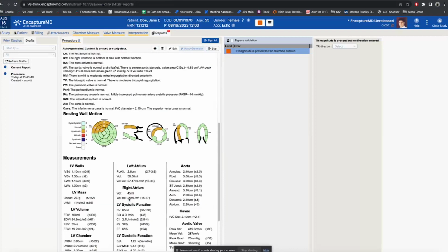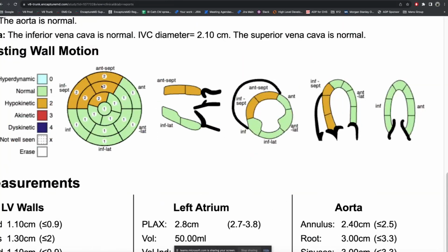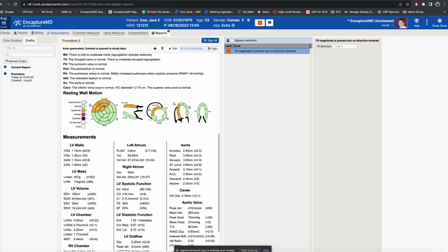And also when I fax it, it's designed in such a way that if you look at it, you can see that there's numbers that correspond to the areas. So if I print this in black and white, it's still visible. But if I do have a color printer, or I'm looking at it on the screen, then I have everything I need and it looks great.